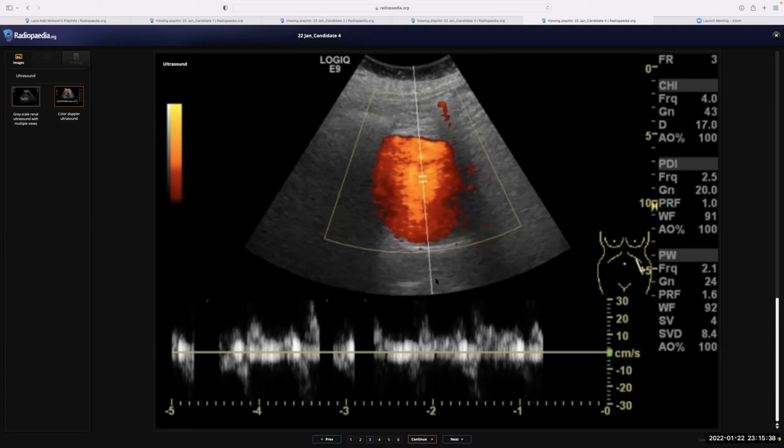I would recommend a contrast enhanced CT scan to further evaluate this case, and I want to confirm the region of this lesion. Is this that mass lesion only, that left lower pole mass lesion, or is it any aortic aneurysm? Okay.